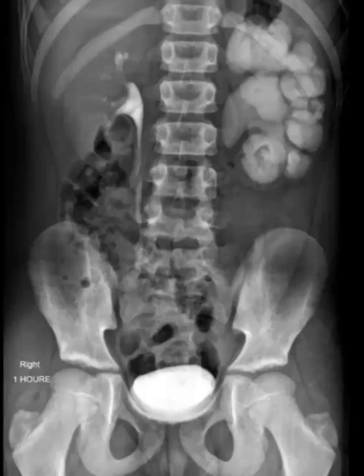So if I am the examiner, how will we differentiate between the calcification? It looks like a calcified kidney. You are right, but you can see the contrast on the right side. So contrast is going as well as into the bladder. Because the contrast is present on the right side as well as in the bladder, that is a differentiator. Whenever there is contrast present, you should call it hydronephrosis. This is the point: especially you can look on the right side counterpart as well as the bladder.